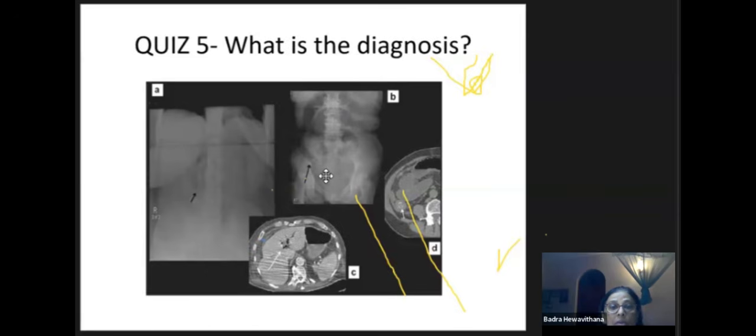So the diagnosis that should come to your mind is this: gallstone ileus. It is not shown on the X-ray, but you can see a very thin line of calcium. Most of the stones have central lucency, fatty or cholesterol-like. And this is the aerobilia again shown on the CT. So this is a case of gallstone ileus.